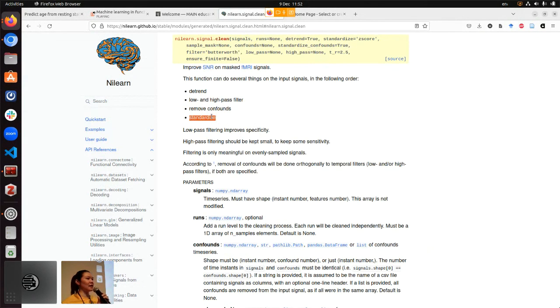We have talked about standardizing your data. This is especially for raw neuroimaging recording. I would definitely recommend you to look into the textbook definition of these things a little bit more.